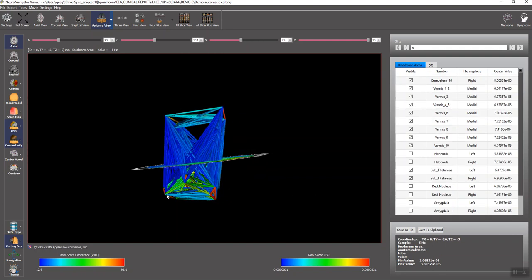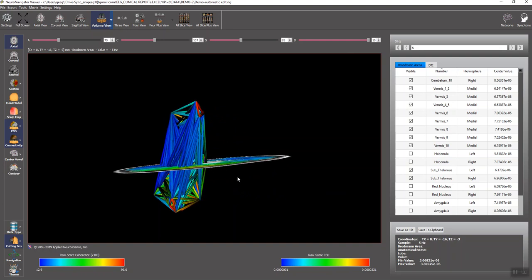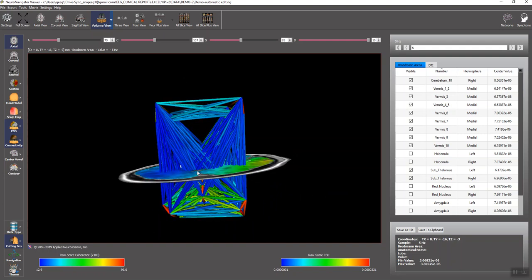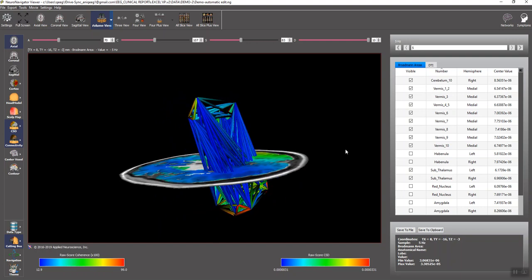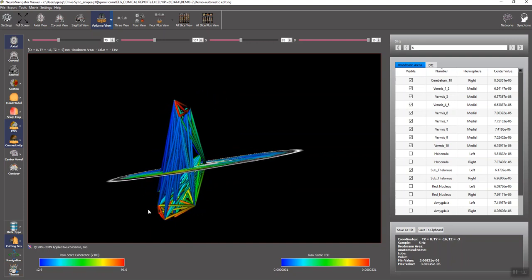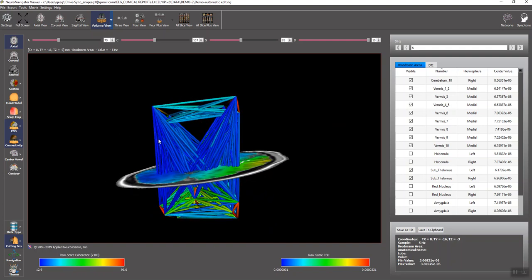And now we have the full complement of, and with a mouse wheel, you can expand this, of the cerebellar connections through the thalamus to the motor cortex up here. And one thing you can see is that the coherence, you can see the scale here, is reasonably high in these local regions, both in the brainstem and cerebellum and in the motor cortex. So there's a local high level of coherence, but the long distance connections are blue.